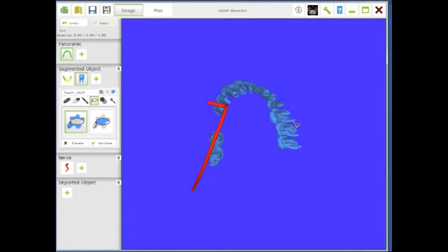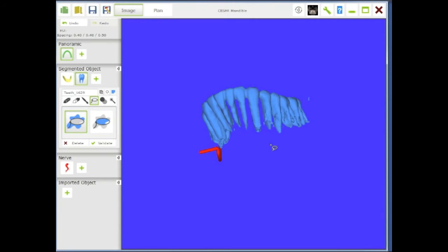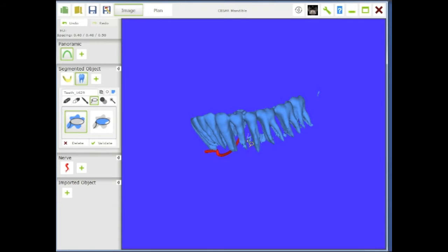So what you need to select in a good way is the threshold, and when you have the threshold, then you know how your bone is going to be rebuilt or your teeth are going to be rebuilt. So now let's say as an example that I have been cleaning that enough to show you how to do it. And we have quite a good image of the roots now.